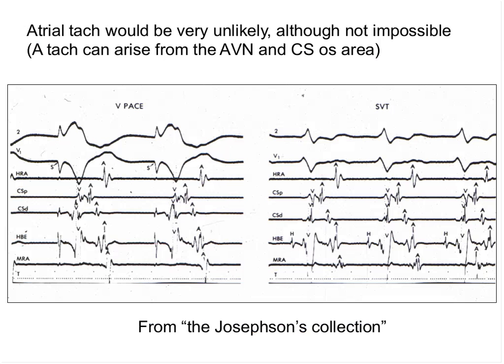So let me provide you an example here. This slide is taken from the clinical electrophysiology textbook of Mark Josephson, so I call it the Josephson collection. There are beautiful examples of beautiful tracings there, and this is one of them.